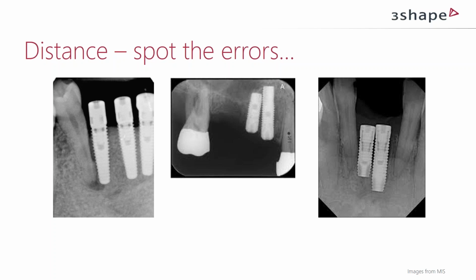When you plan your implant treatments, you need to consider what room do I have available, where do I have bone, but I also need to hold that up against, am I placing short versus long, am I placing a conical versus a straight implant. There are a lot of variables in play here, where of course digital tools will help you build a workflow and a routine to arrive at the right decisions.